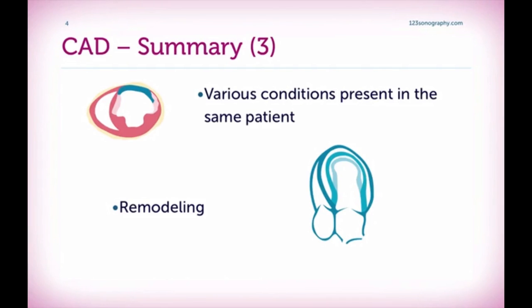These various conditions can be present in the same patient, even in the same view. Remodeling is an important concept which is usually caused by large infarcts, where we have progressive deterioration of left ventricular function, which also affects segments which are not infarcted.